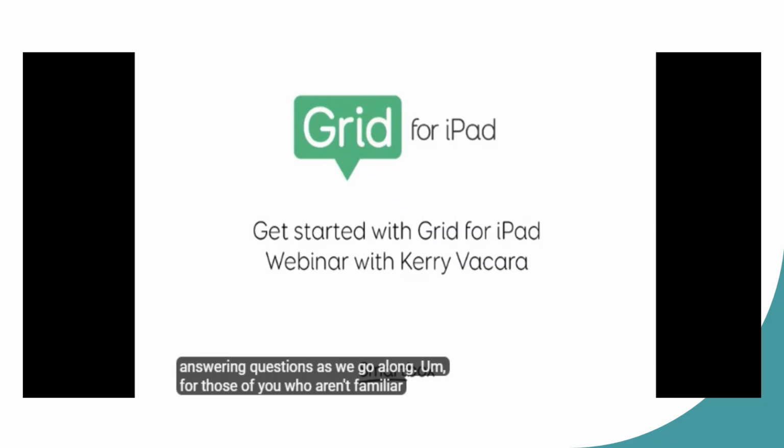For those of you who aren't familiar with Grid for iPad, it's a complete AAC platform that includes instant access to resources for both symbol and text communication. It's got a touch-first design. It's got an intuitive user interface, which includes in-app editing that enables you to edit and create resources directly within Grid for iPad. And it's designed for anyone without speech, and it's suitable for a wide range of conditions. So I'm going to take you over now to look at Grid for iPad.